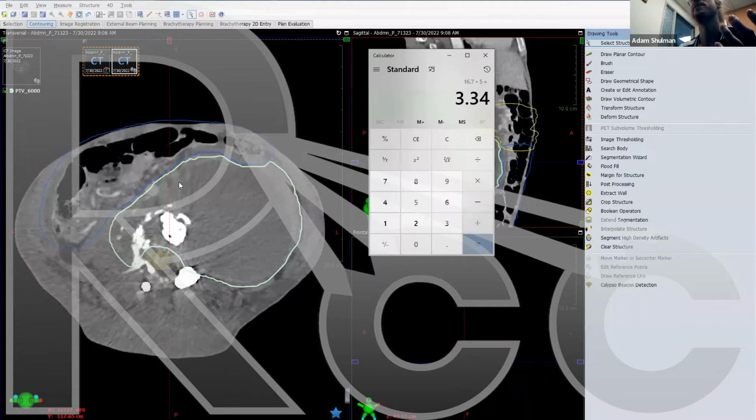And so if I optimize like this, again, I know my shoulder has to fall in order to spare my bowel, but it's a large volume. How much do I let my shoulder fall? Do I let it fall this much? Do I let it fall this much? You have no idea. What's going to end up happening is you get cold spots all through the PTV, and you're going to get a really wide gap at your margin here. And so if we can maximize that dose fall off by separation of PTVs, we'll get full coverage of PTV, full sparing here.